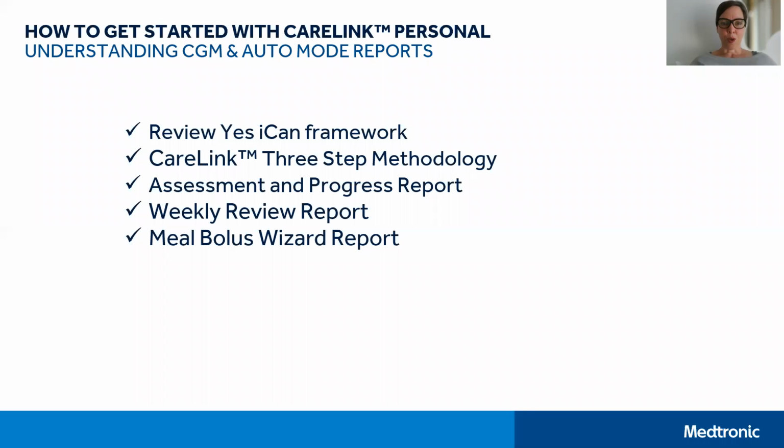In this video, we're going to quickly review the Yes I Can framework along with the CareLink 3-step methodology. For a more detailed look at both of those, you can review video 1 and video 2 in this series. Then we're going to orient you to the assessment and progress report, the weekly review report, and the meal bolus wizard report, and take you through a quick case study to show you how it's done.